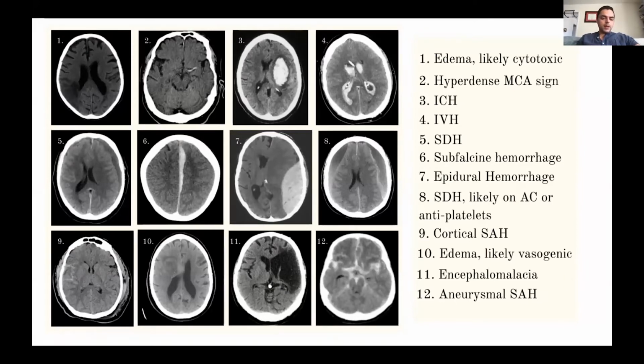And then, one other thing to keep in mind, the subarachnoid blood is pretty cortical, so you'd want to get a better history because you never want to miss a mycotic aneurysm, or an aneurysm caused by a bacterial infection. So that's something to keep in mind. This is some vasogenic edema. This is encephalomalacia, so probably this area of brain had been stroked out, or they had a surgical resection.